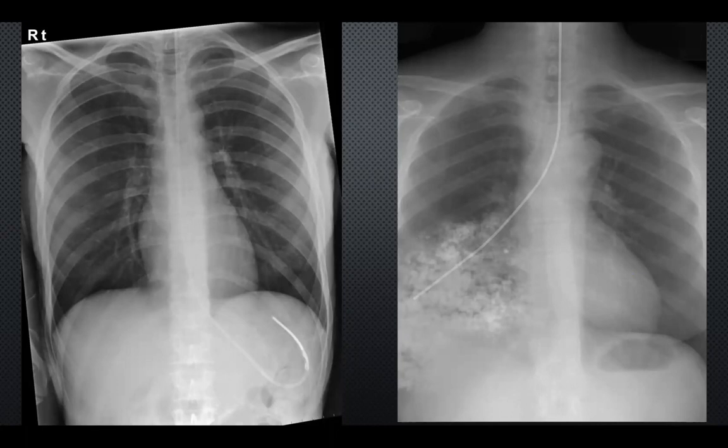I think I've got it the wrong way around. So I'm looking at the right. So you're probably thinking the right is cardiomegaly with all the white fluffiness around it. No, left. Left. Okay. And what makes you think that's cardiomegaly? Because on the left side, the left border of the heart is becoming increased. I think it's both shapes. Okay, okay. I like the way that you're thinking.